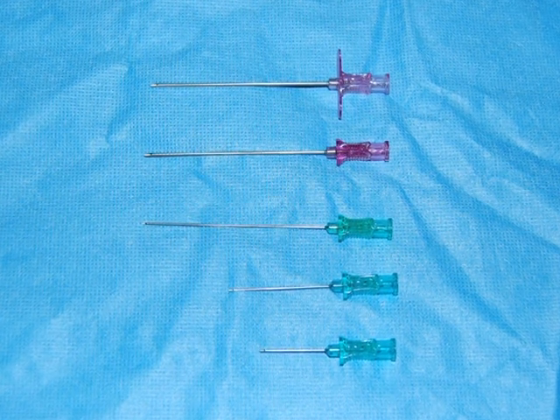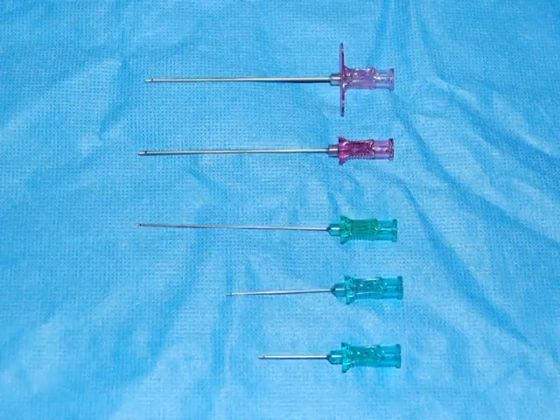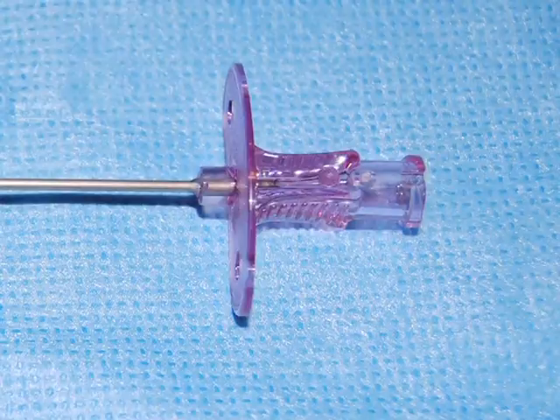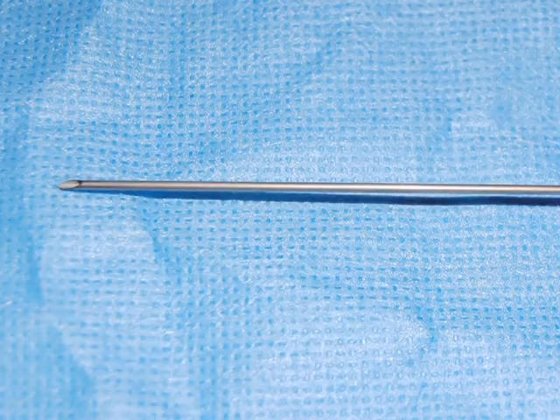For the access site needles for the femoral artery, it is common to have a marker on the plastic hub indicating which direction the bevel is facing. There may be a protective shield or flange which makes handling the needle easier. The needles are about 2.5 inches in length.